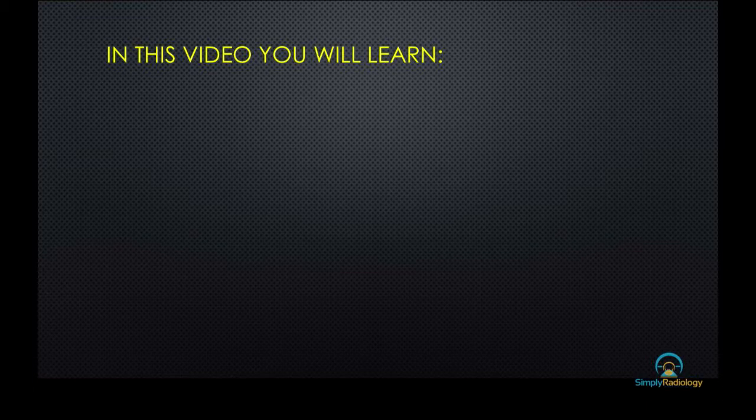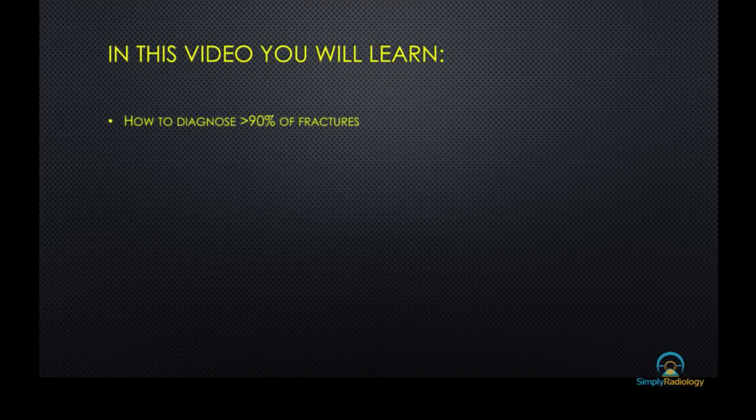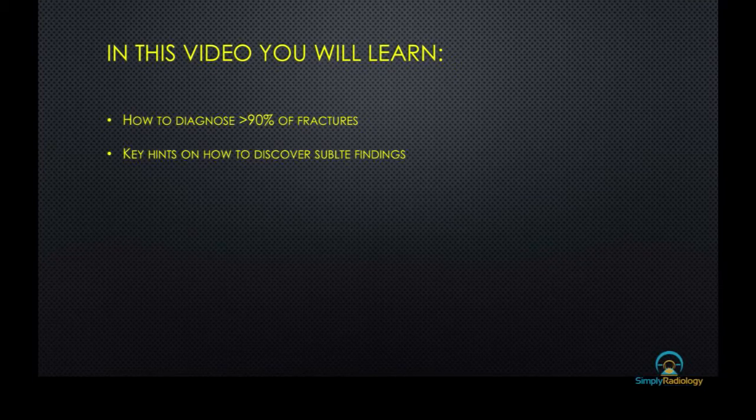And to be honest, I wish I had this stuff before I began my specialty because this would have saved me so much time. So what I want to show you today is how to diagnose almost all fractures that you will find in the elbow joint. I want to give you key hints and really important tips and what to look for in every image.